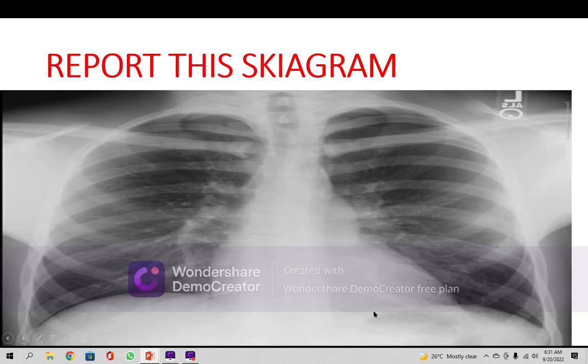Now this is his X-ray chest. Now the X-ray chest was reported like this. The requirement for these patients is that it should be a PA view. Why is it a PA view? Because the spine is not markedly visible and intercostal intervertebral spaces are not visible. It should be clear. Now this is the spine which is going on like this. So he has got scoliosis, and this is a very interesting finding in this patient.